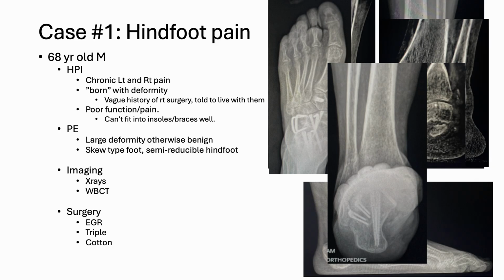That's the hindfoot alignment. So again, trying to get everything neutral as best we possibly can. I get hindfoot alignment views preoperatively and postoperatively. As you can see, with his deformity, his calcaneus changed shape over time. It tried to get itself to a neutral position. I've realized on these patients that have had a severe deformity for a really long time, if you overcorrect to try to get the talonavicular joint perfect on x-rays, you might put them in a little bit more valgus or varus position than you would want. I've learned a lot through my own work, and now I routinely get hindfoot alignment views preoperatively and postoperatively.